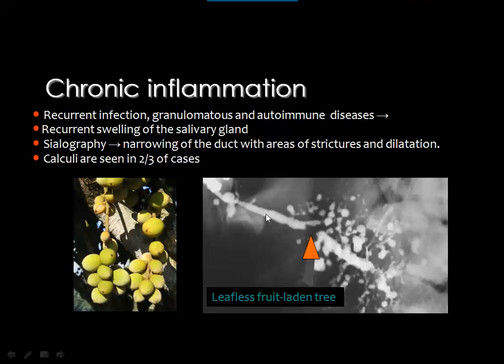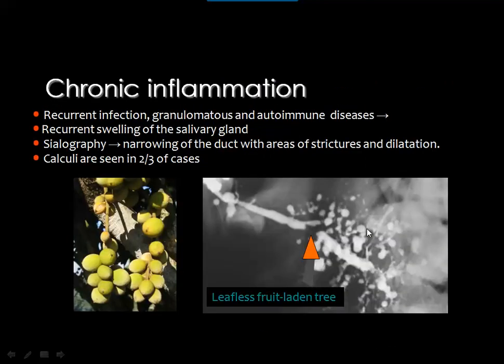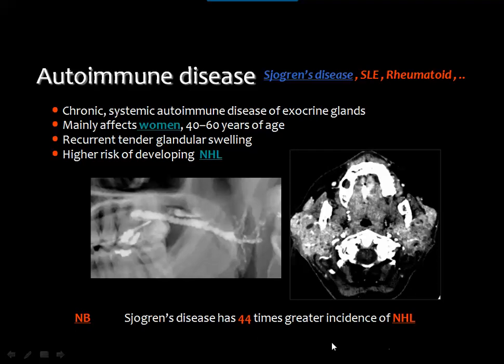And here is the main parotid duct, and you can see that there is some pooling of contrast within the duct system, giving this characteristic appearance. We call it sialectasis. Whenever the pooling is minute, like these dots, we call it punctate sialectasis. While if it is large, we call it sialectasis with more contrast pool. I do not remember exactly its name, but we call it sialectasis.